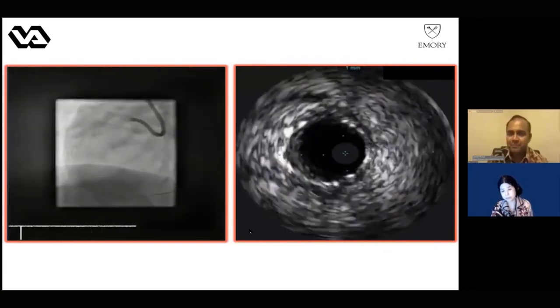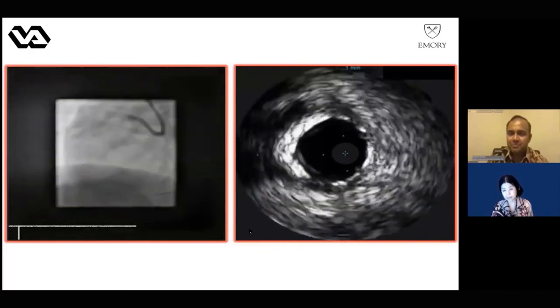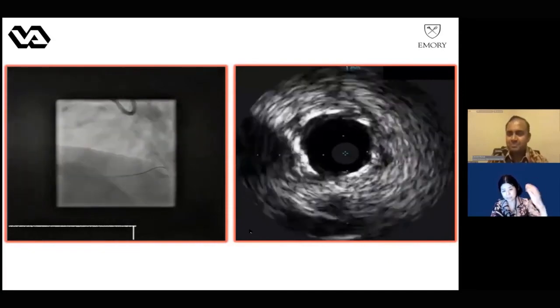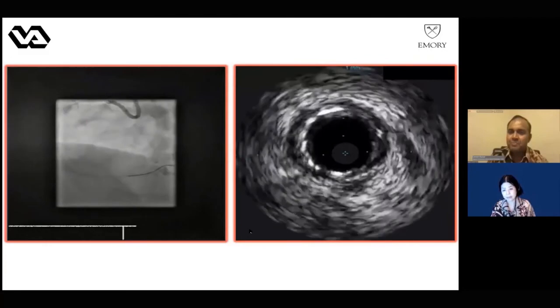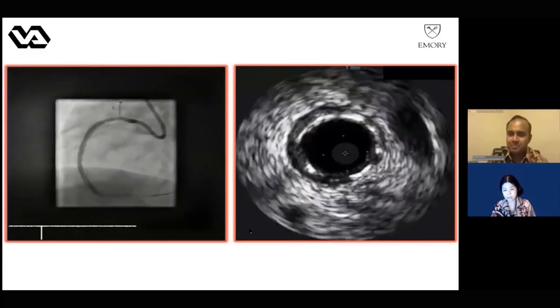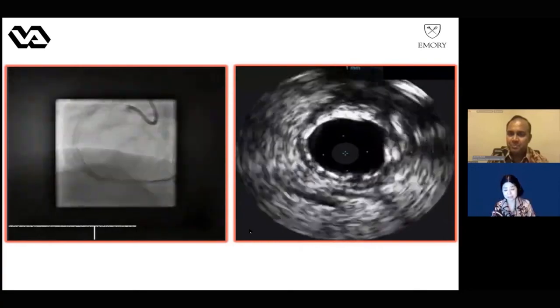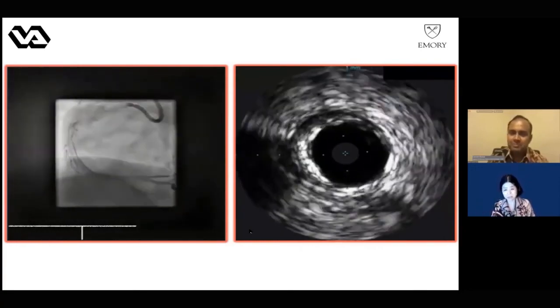But if you want more detail about the mechanism, you have to make the fracture behind the stent. But it's really fracturing everything. You see the calcium behind the stent. But in this case, because it's very well fractured, I really don't see any calcium fracture to point to in this picture, but anyway, it's very good expansion.